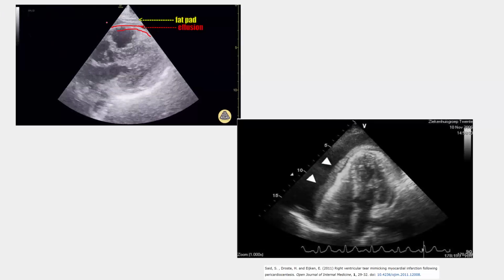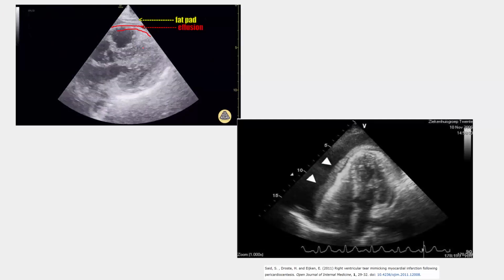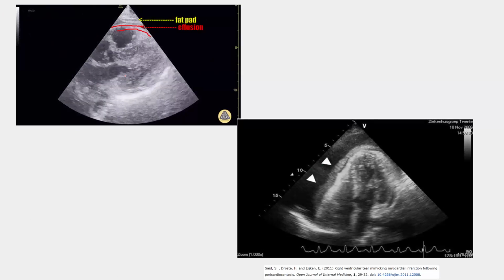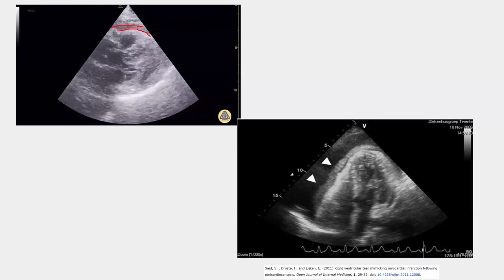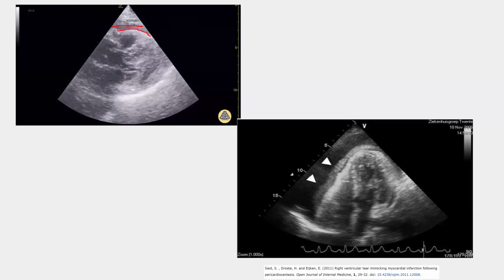This is fat, okay? And around the heart we have two pools of fat. One is immediately adherent to the myocardium, and this is epicardial fat. Then you have the parietal pericardium, and overlying the parietal pericardium is pericardial fat.